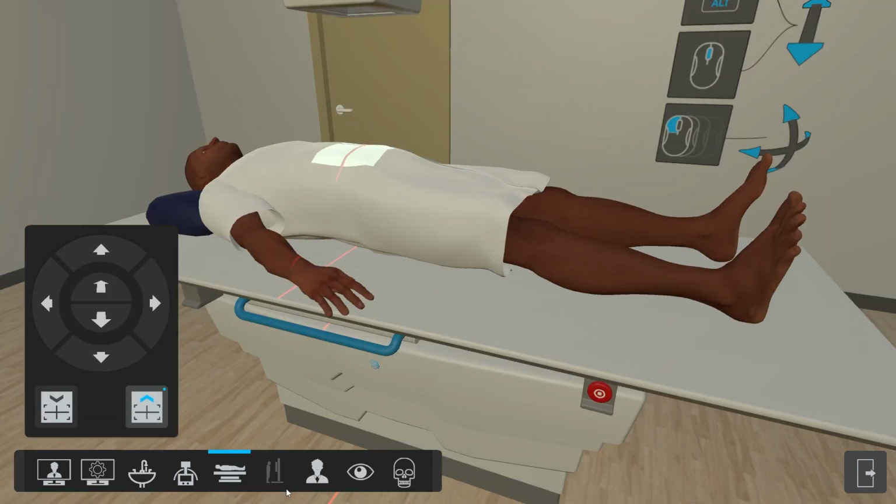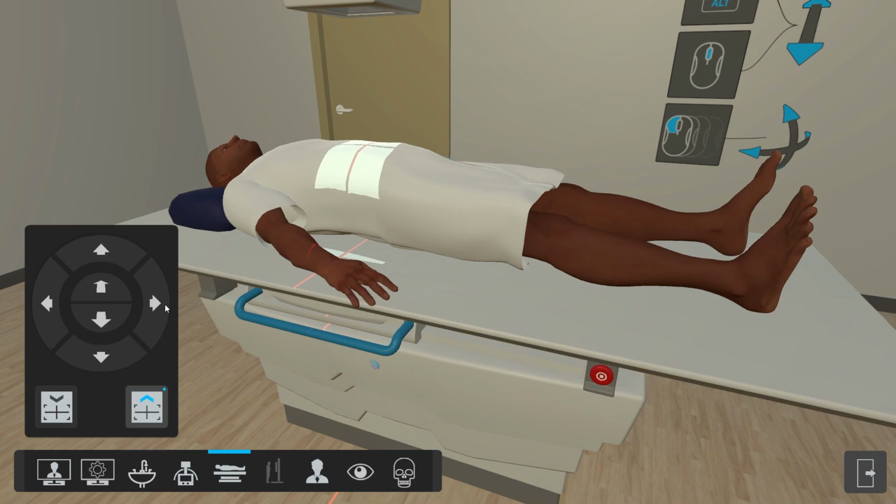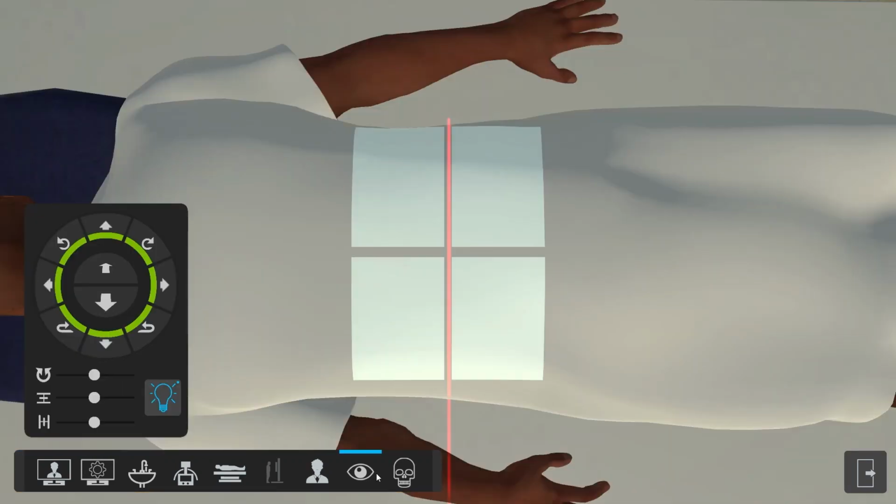If I go into the patient now here on the table, all I have to do is move him around so I think he's in the right position. And that will be a combination of looking down from above and looking from the side. But what I shouldn't do is move the tube or the patient at this stage. So it's just the table I'm moving.